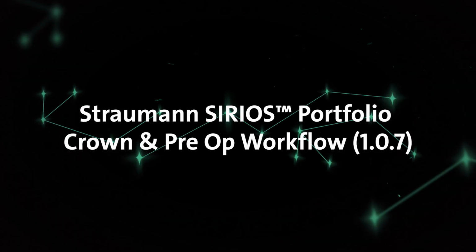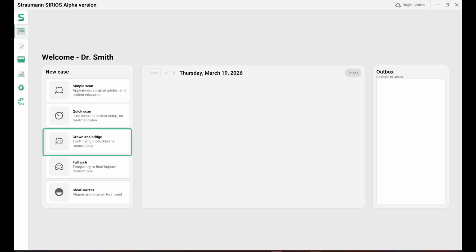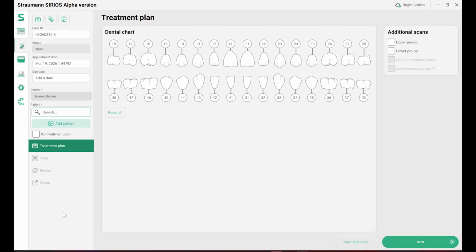Straumann SIRIOS portfolio, Crown and Pre-Op Workflow. Select Crown and Bridge to create a new crown case.